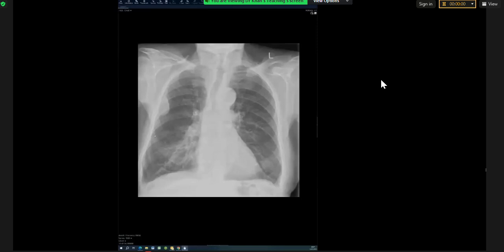So in summary, I have a pleural-based mass with bilateral calcified pleural plaques. My primary differential in this instance would be a mesothelioma, but I would like to correlate to previous imaging, as I also know that there is one other differential for a benign pleural-based mass, such as a pleural fibroma. So if I can have a CT, it would allow me to better interrogate this lesion.